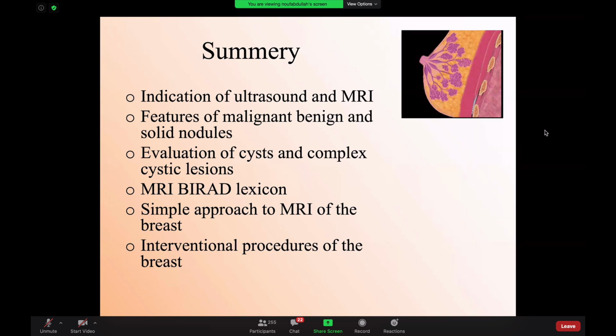So that's why when we do mammo and ultrasound, I would give 1 report for both of them. And I would say that the right breast BI-RADS is, for example, 3. The left breast BI-RADS is 2. And you always go with the most suspicious features.